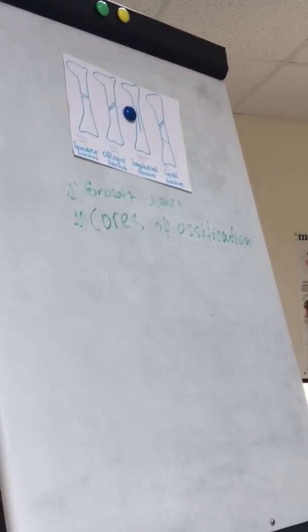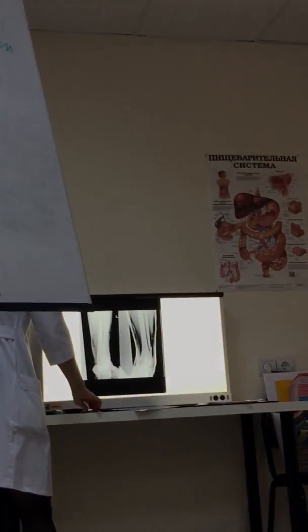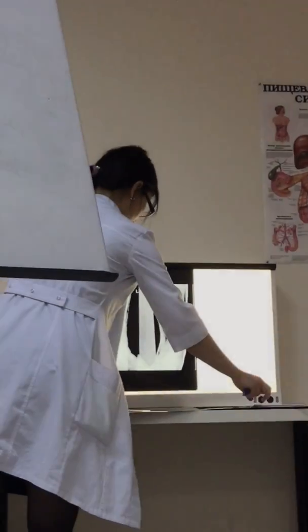This is oblique or transverse? This one. Oblique, yes.